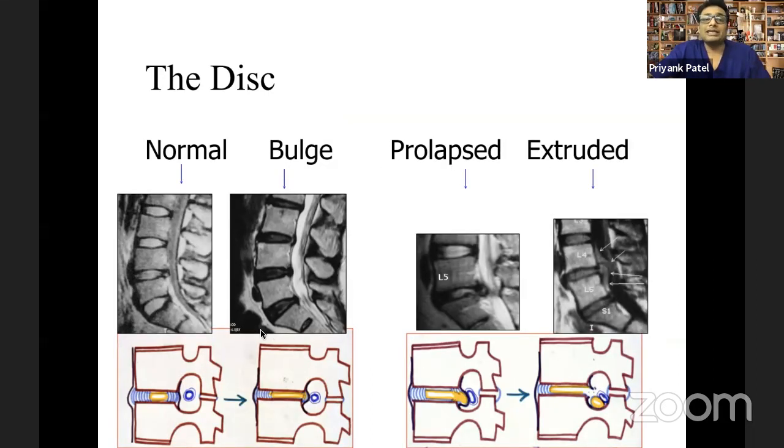So when you actually see that on an MRI, this is how a normal MRI is going to look. Remember, again, all of these are T2 weighted images. Somewhere you will see T1 weighted images also, but T2 weighted images is where you have to identify all this. So your disc will look white in color with a black outline. And behind your dural sac, you will see empty white spaces. These empty white spaces are basically nothing but epidural fat.